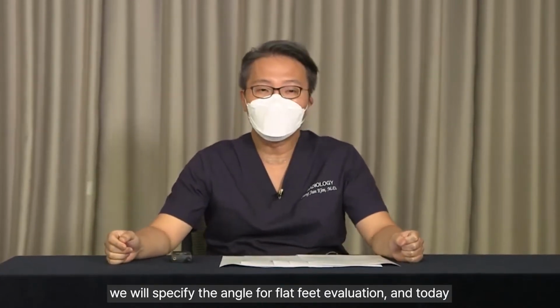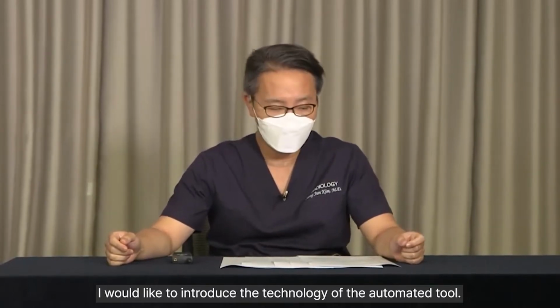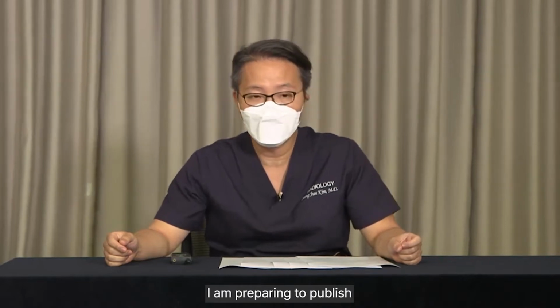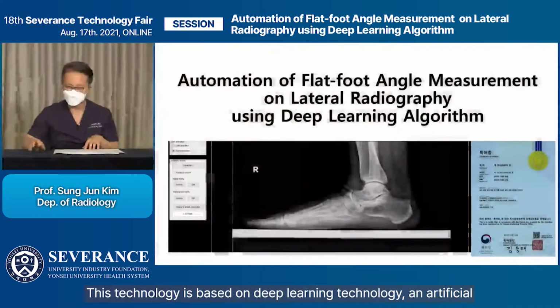We will specify the angle for flat feet evaluation. And today I would like to introduce the technology of the automated tool. We completed the patent registration last May. I am preparing to publish the clinical verification results as research papers.